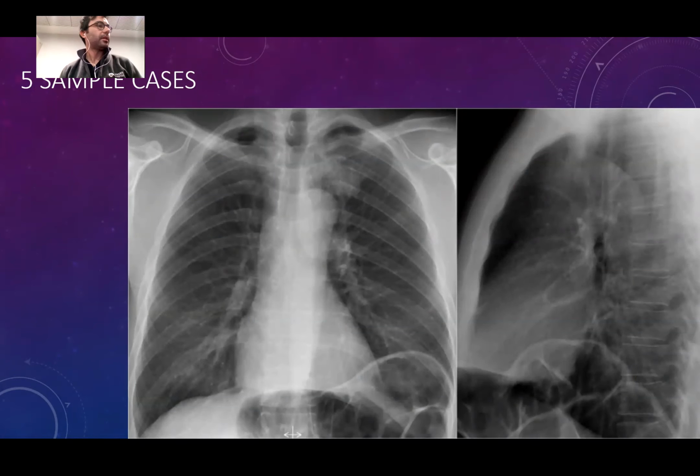Can anybody see some abnormality here? Is there effusion? Where? Like in the right, yeah, this. Don't we see bowel loops there? The costophrenic sinuses are open, right? So there is not an effusion here. I'm also seeing the posterior space, it's open. There is no effusion here, doctor.